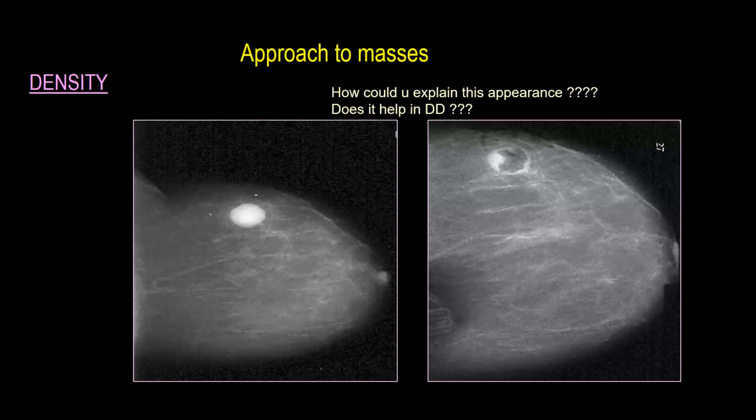Intervention. Aspiration, biopsy or the like from the mass. Why did you say aspiration? The logic is yes, there is intervention. It is obviously here. There is an effect of interventions. And what did occur after intervention? Fat necrosis after intervention.